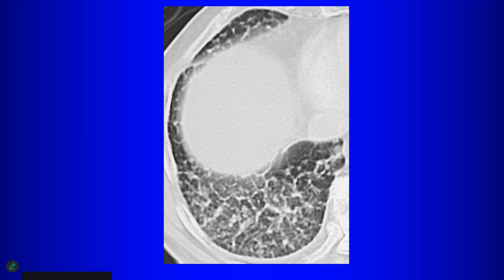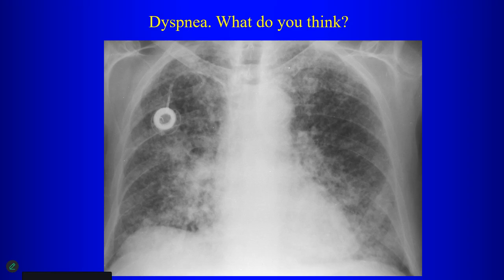Yeah, so we have interlobular septal thickening, and when we have interlobular septal thickening, we try to decide what? Is it smooth or nodular, right? This one you think is, well, what do you think, smooth or nodular? Yeah, it looks somewhat more nodular, right? So if we have nodular interlobular septal thickening, what do we think about then? Yeah, especially at the lung bases, lymphangitic carcinomatosis. Of course, the clue here, you have the Port-a-Cath, so that's a giveaway, right?